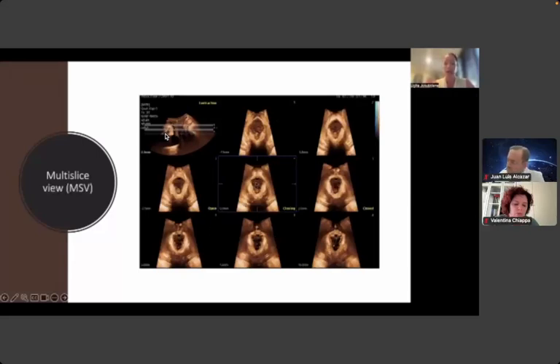We see every slice corresponding to the image. Of our particular interest are these 3 images. The image in the middle is the one with this purple line, and all other images from one side to the other are 2.5 millimeters further from it. We look at these 3 images and we assess the attachment of the levator ani muscle to the ramus of the symphysis pubis.